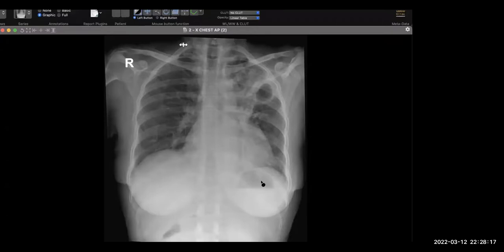The cardiothoracic ratio is okay. There is no pleural effusion. Looking at the bones, the distal end of the clavicles appears slightly osteopenic. However, I will correlate with the history. Other than that, the bones appear normal. Bilateral breast shadows are normal. I can also see some retrocardiac opacities, so this could also be a part of the infection process which is going on in the left lung.